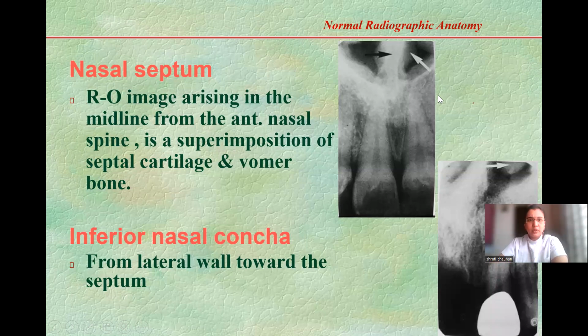What are we talking about next after the inferior nasal concha? The incisive foramen. First, we just read this, then I will explain. If you want, you can just look at this black thing between the two central incisors. Can you see a black thing? Keep that black thing in mind. Let's read.